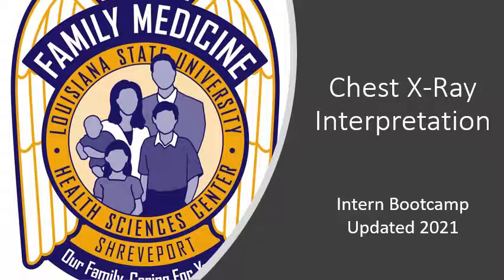Hello and welcome to the Chest X-ray Interpretation Bootcamp module. What we're going to accomplish in this module is being able to quickly identify any type of chest X-ray abnormalities, as well as being able to understand what we need to do with those abnormalities.